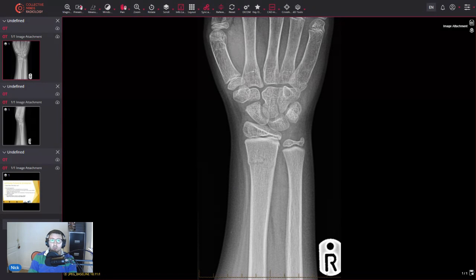But because paediatric bones are a little bit more malleable, think about why these are called greenstick. If you see a new, green twig and you bend that twig, one side of it will break, but because it's so malleable, the other side doesn't tend to. It tends to bend. One side breaks and the other doesn't. And that's exactly the principle here with this type of fracture.